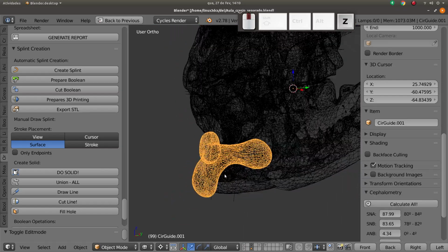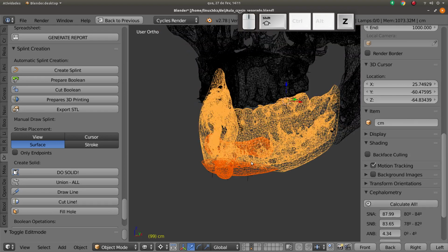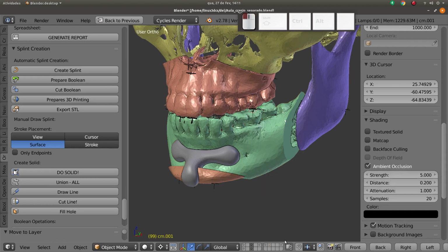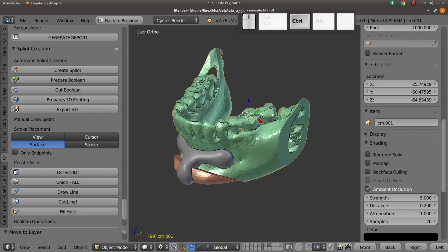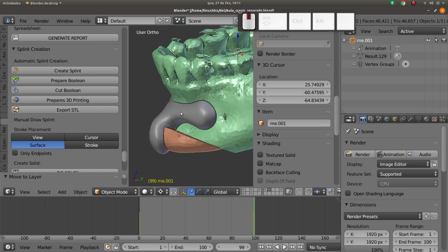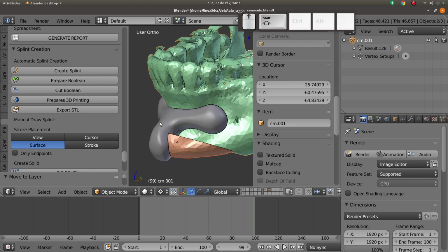Now I can do the same thing I did before. You can select the objects, copy and duplicate them, put them in another layer, and go to hierarchy, inactive object, and take out the animation. Now you can select the two objects, or you can directly do it.